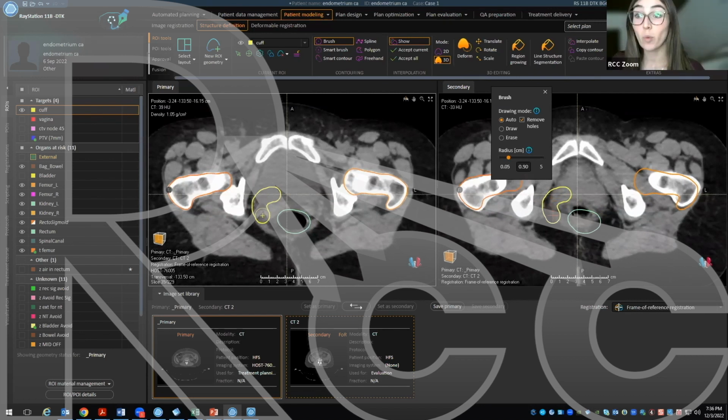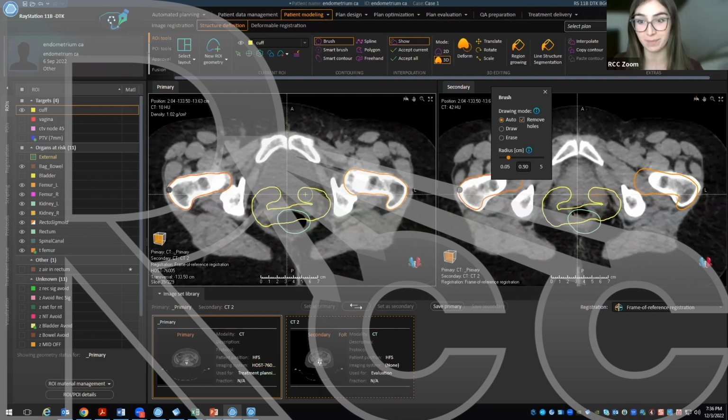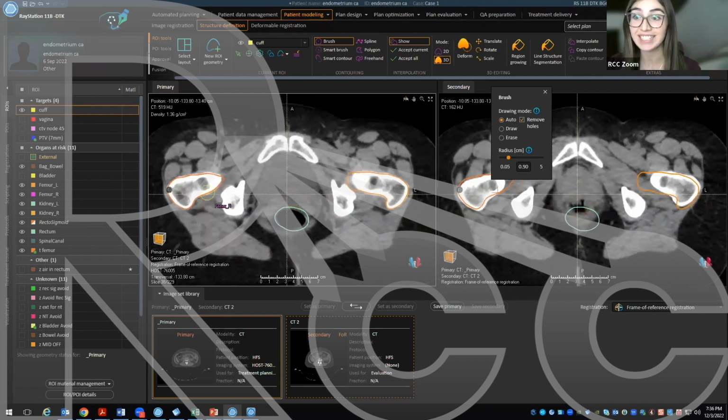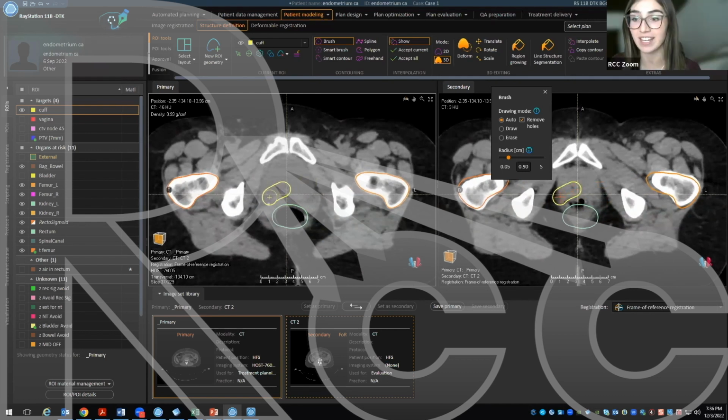Dr. Jhingran, while you contour, there are a few questions, so you can try to answer while you contour. One of them is, do you spare your urethra in your CTV? That's one question. And the other one is the length you use from the apex to the CTV.